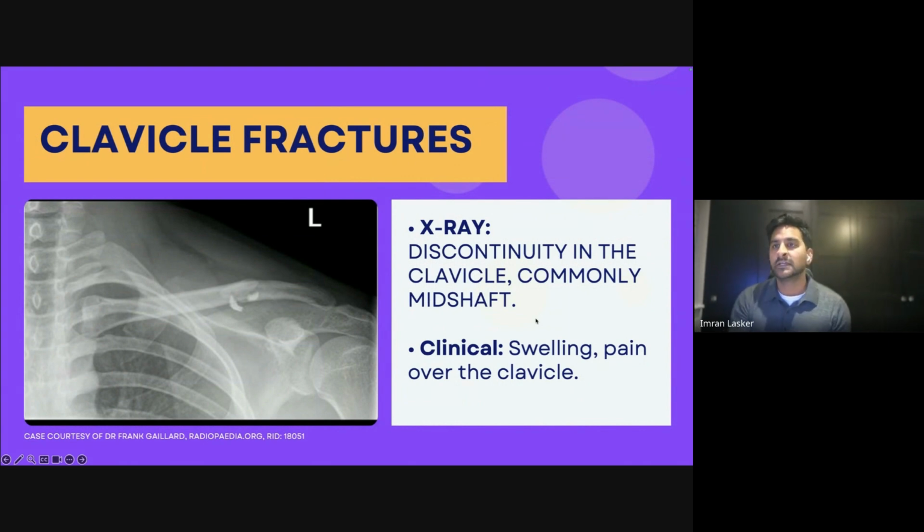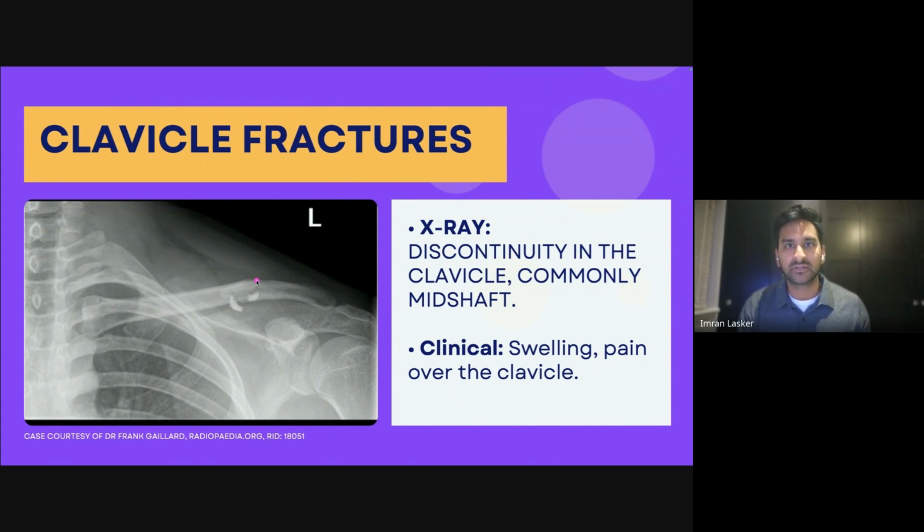Right. So now we're moving on to clavicle fractures. I don't think this is the most obvious fracture that we can see, but you can see that there is a bit of a linear abnormality located here and a bit of an overlap with respect to the clavicle. And I don't think this is the first injury they've had with regards to the clavicle, because if you look at the clavicle, you can see these linear densities located here, and they're far too dense to be bone.